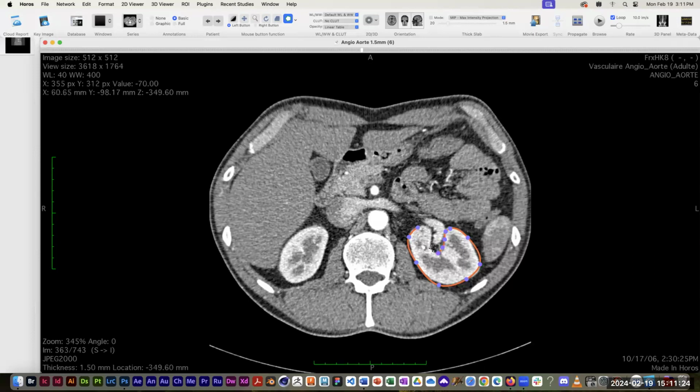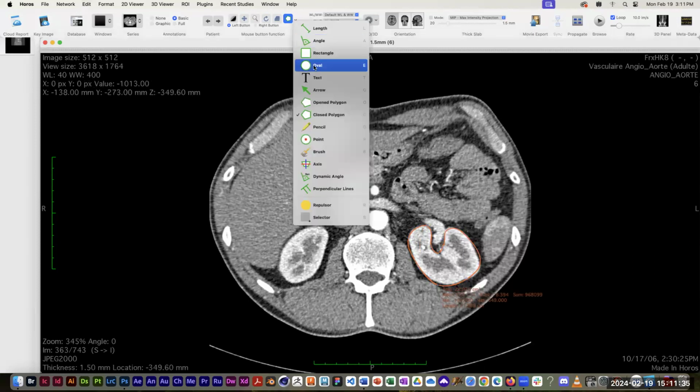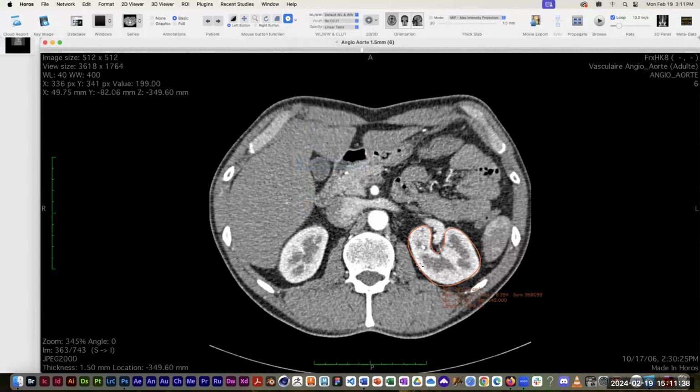So we're going to go way inside into this deep space inside the kidney and really need to adjust these points quite a bit. Those got really kind of weird. There's got to be a way to hide this silly thing.